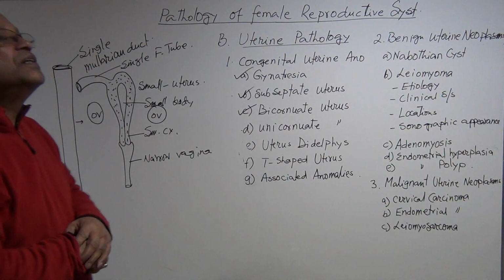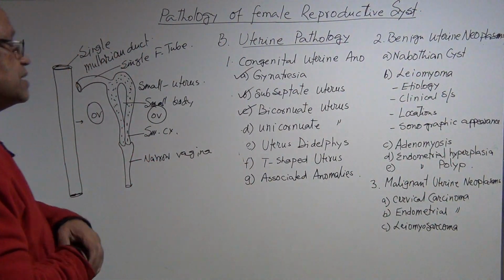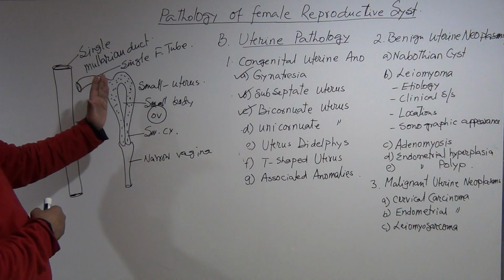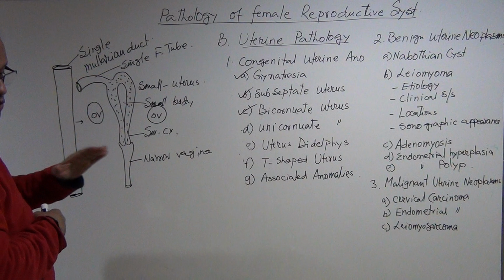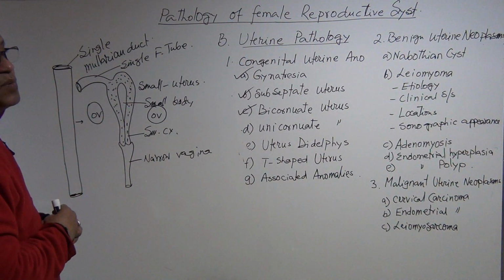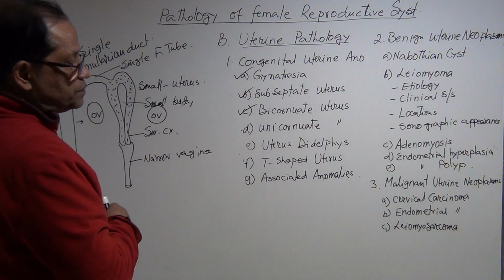Okay, so this is the situation, and normally we cannot see the fallopian tube sonographically unless it is dilated due to some obstruction.